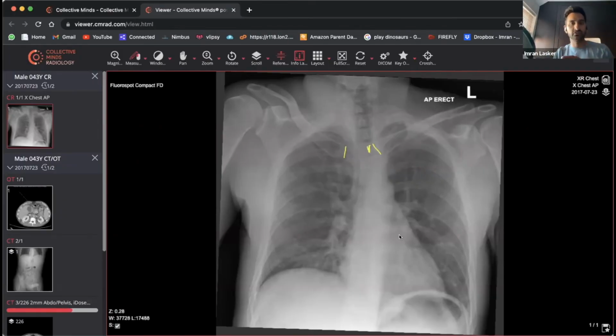And that's why you don't use the clavicle with the sternum, because if you have something so close to each other, for them to go out of line with one another takes quite a while, right? Whereas you've got something quite far from each other, they get out of line quite quickly. So it's a really good way to try and figure out whether someone has got a rotated film.